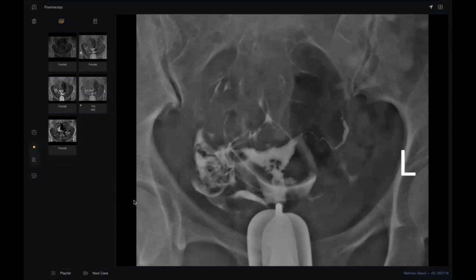Sir, this is Asherman's syndrome, and it's most likely post-surgical. In TB as well we have found this type of adhesion, but the cavity is normal, while here there are persistent defects.